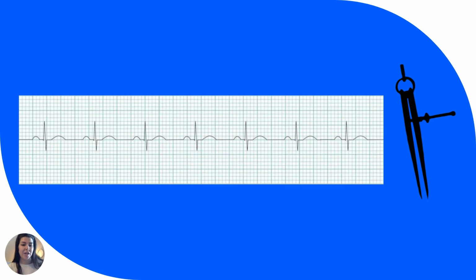This is another strip of normal sinus rhythm. This is something that I see every day. This is what normal people's baselines are in. Unfortunately, other baselines could be ventricular pace, atrial pace, which obviously means someone has a pacemaker, or atrial fibrillation, which happens in the top of the heart. That is similar to ventricular fibrillation, which I showed you earlier, except it is not a lethal rhythm. And that can be controlled or uncontrolled. If it's controlled, it's under 100, and if it's uncontrolled, it's above 100.